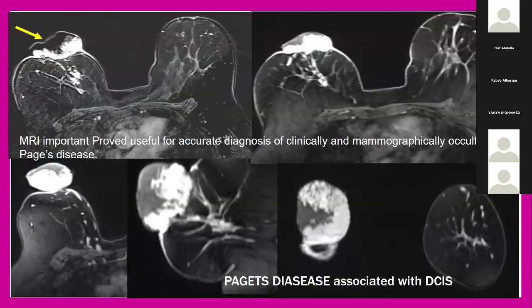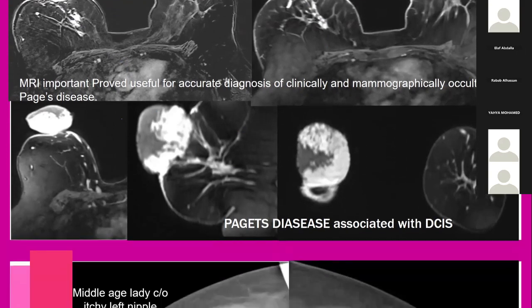And this is her MRI, which confirmed the fungating nipple mass with ulceration, and the residual soft tissue intensely enhanced, as well as enhancement of that asymmetric opacity, demonstrating segmental clumped, non-mass-like enhancement. It was proven to be Paget disease associated with underlying DCIS.